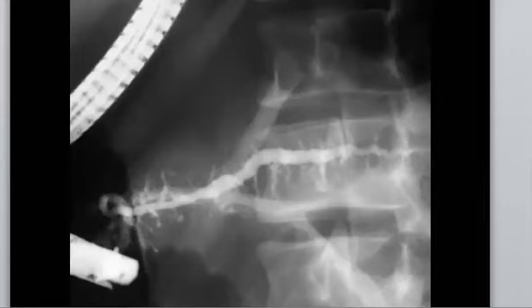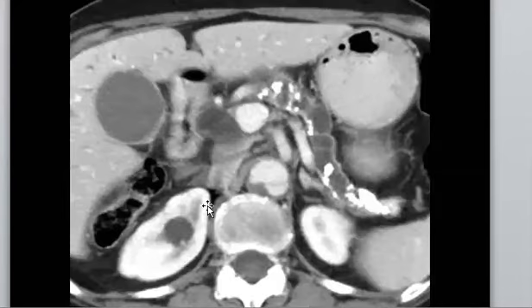And if this patient did ERCP, you can see that there is some irregular dilatation of the main pancreatic duct and the side branches, along the expected site or presumed site of the pancreas. So with pancreatic atrophy and stable calcification, I agree. All this gives you this appearance.